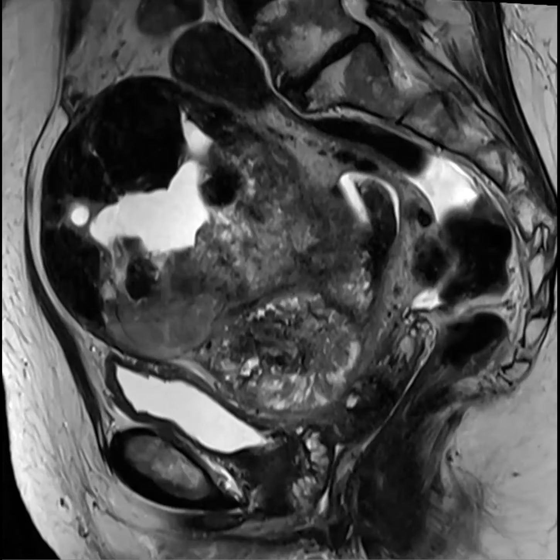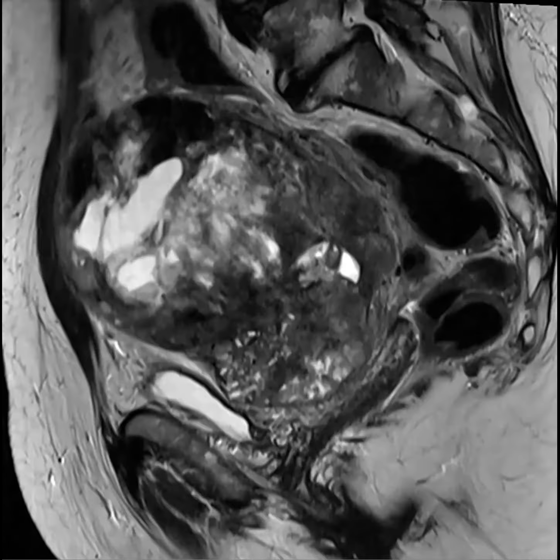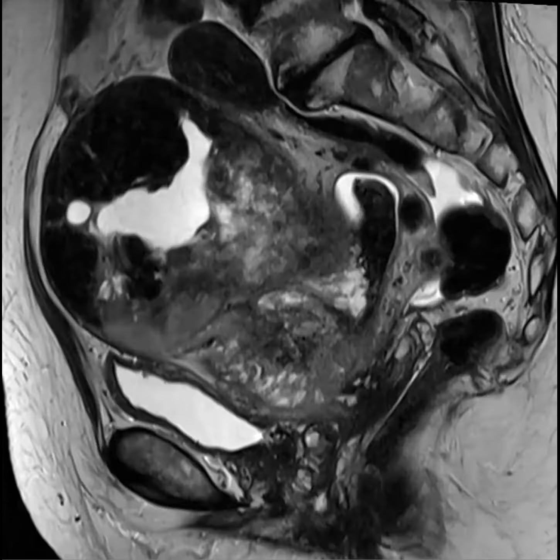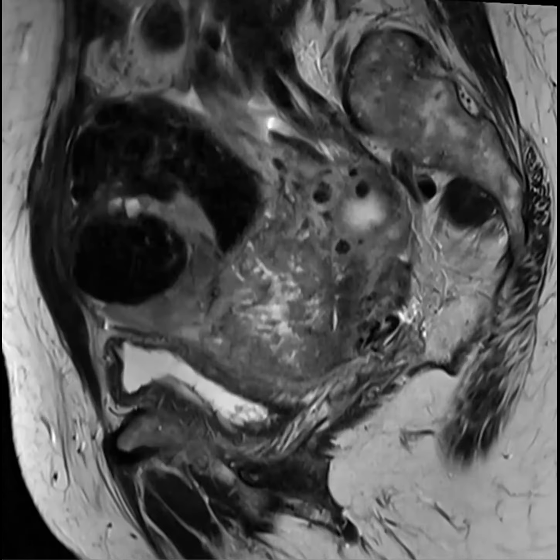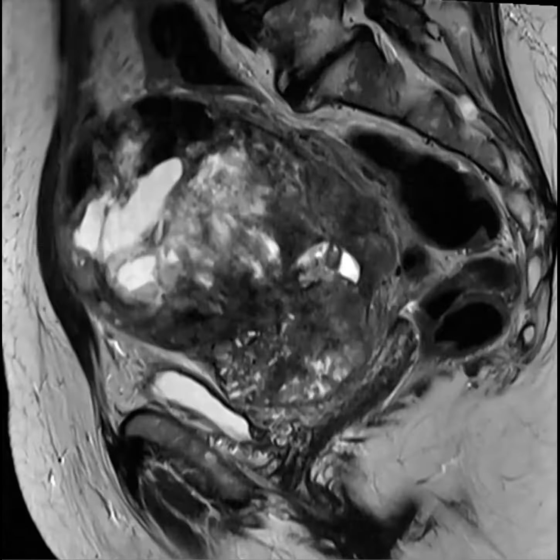So this one definitely looks, yeah, really agreed, dark ADC. It's interesting on the T2 though, at the top of the lesion it was super T2 dark. Maybe that's a separate fibroid or something. Yes, exactly. If I had to guess, the T2 intermediate signal here is probably areas of LMS, with a normal conventional T2 dark fibroid in the fundal area.